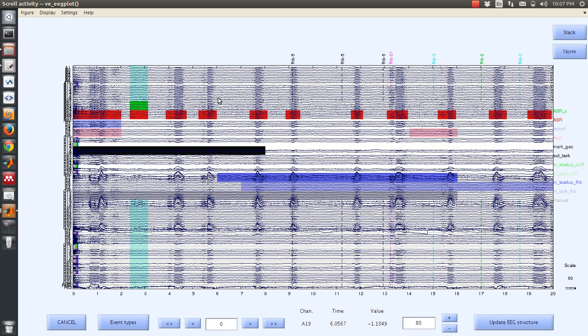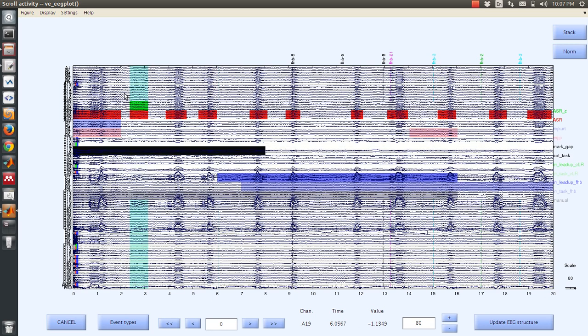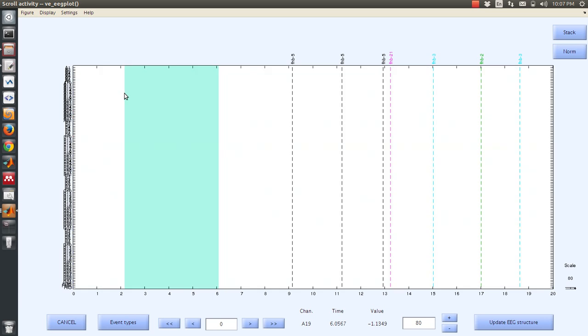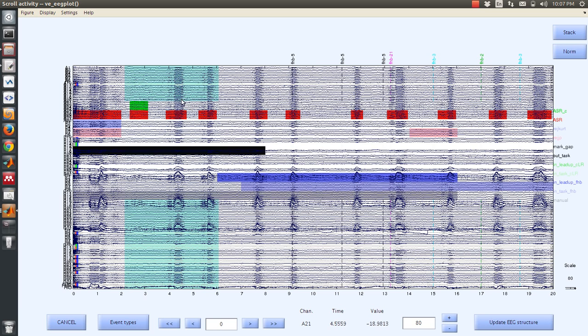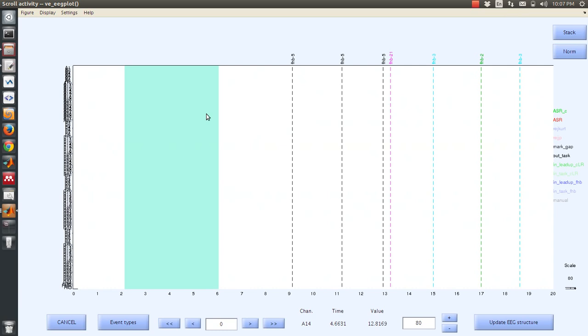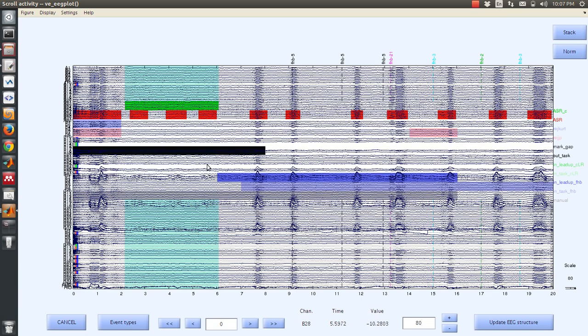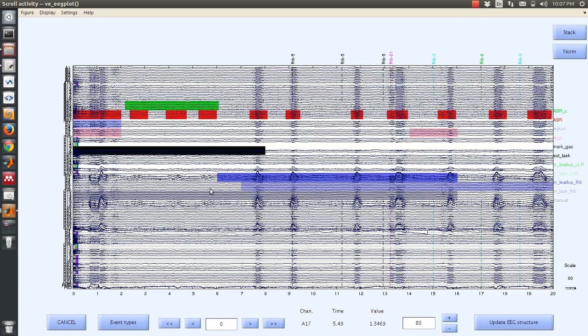Now I can also do this by just choosing manually an entire period of time, like this, and then on this period of time, clicking C, and it will correct any periods of time in here that have been changed with the ASR criteria. Now, let's say I decide that I'm not happy with how this correction happened, and I want to let, for example, ICA handle this.